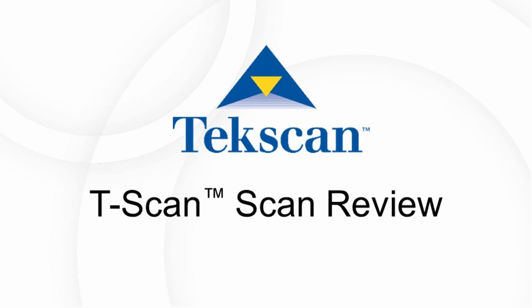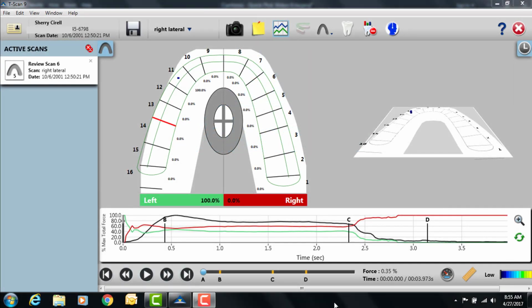Welcome. In this demonstration, we're going to walk through an excursive movement and how to identify whether the excursion is exactly what we're looking for in regards to canine guidance. If we look at the scan, it's just a general right lateral excursion. You have your A, B, C, and D lines.